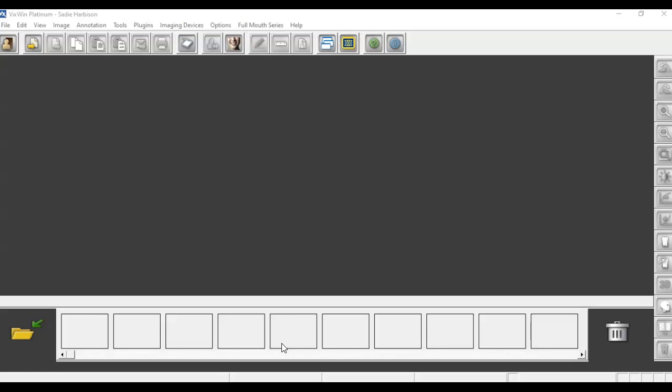So I think they're working on it, but I can show you a few things, and we'll go over this in lab as well. So you'll have a patient selected. I have selected my daughter Sadie, and she does have films. I just can't open them up. But what we'll do here is I'll show you a couple things.